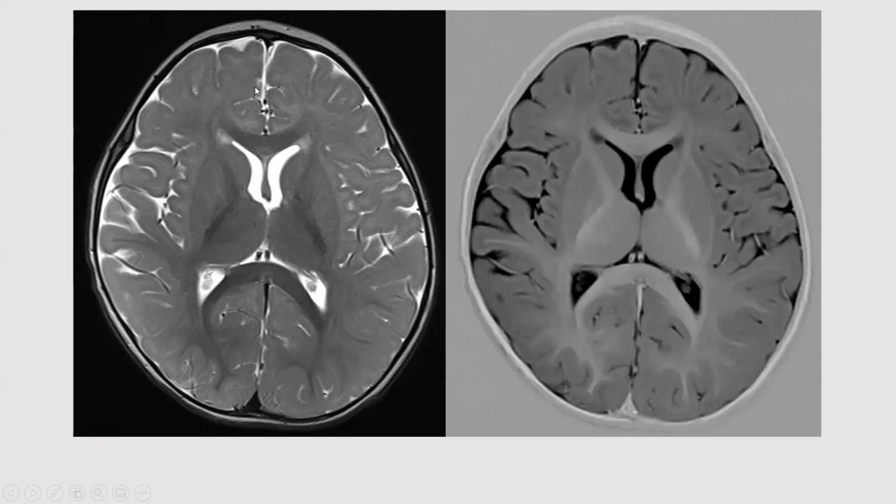But this looks a lot more extensive if we examine myelination on the T1 weighted images compared to the T2 weighted images. We already saw some signal change, but it looks more pronounced and more extensive on T1 in the occipital lobes, extending also here and to some gyri of the parieto-temporal transition area, and even some increased signal already starting in the deep white matter of the frontal lobes. So once again, we see a difference between T2 and T1 weighted images, with T2 weighted images lagging behind T1. How to explain this? Because it's the same degree of myelination.